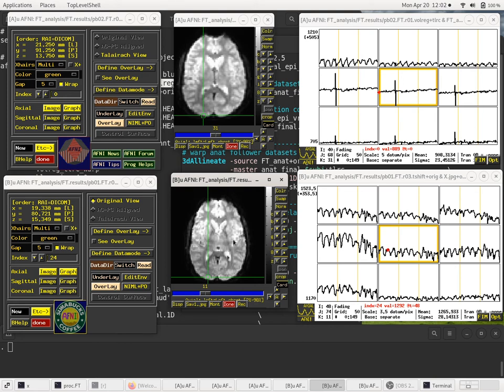If you picture this grid as a bunch of shoeboxes with the voxel coordinates being the center of each shoebox, if you make a 2 by 2 by 2 set of shoeboxes, this voxel center will be in there somewhere in the middle of those 8 centers. So based on the distance from this center to the 8 neighboring centers, you'll get some sort of interpolated value, and so you're blurring values together. So this result will almost always be a blurred version of that one. You also notice it's wider.